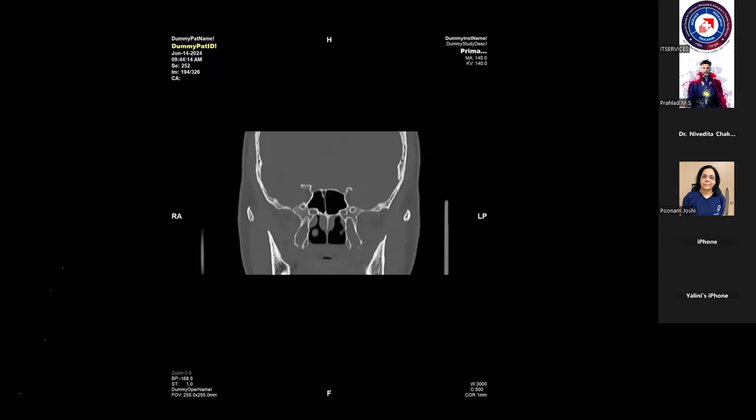Contrast is of value in post-treatment changes, because in a post-treatment scan, if that nerve is within the field of radiotherapy, then it will invariably be thickened. But if it is enhancing, then it will indicate an active perineural spread, because fibrosis will also make the nerve thickened, but it will not be enhancing. It will not add so much value in the upfront baseline scan to detect perineural spread. That will be of value in the post-treatment scan to differentiate true perineural spread from fibrosis.